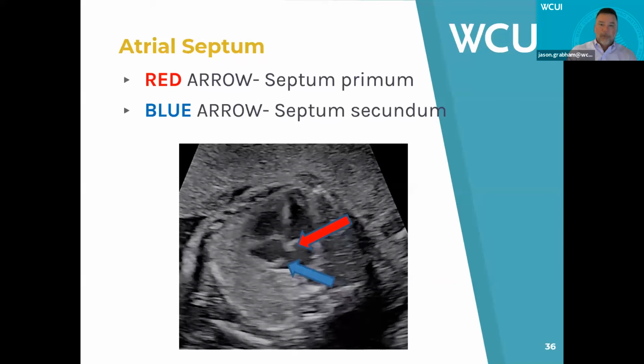Obviously, atrial septal defects are one of the most difficult diagnoses to either confirm or rule out in the fetus, because we have that natural opening there, and that flap of the fossa ovalis can be so thin and so difficult to see. So, but it is key, as Amy said, make sure that we have intact septum primum and intact septum secundum there.